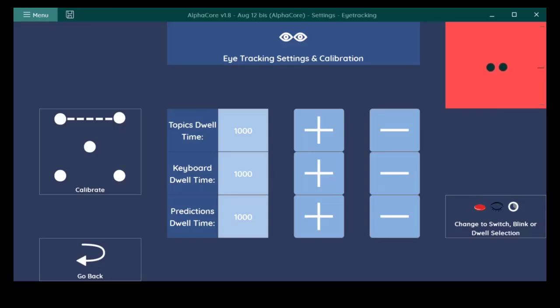Adjust the device position until you see two black dots representing the user's eyes in the center of the screen. The right side of the gaze monitor displays 3 faint lines and 1 dark line. This helps to find the optimal distance the device should be from the user's face. Move the device forward or away from the user until the dark line aligns with the middle short line. If the user prefers the device to be 2 or 3 inches closer or further away from their face, that should be fine.